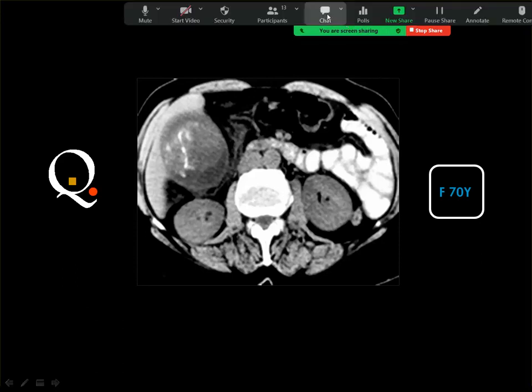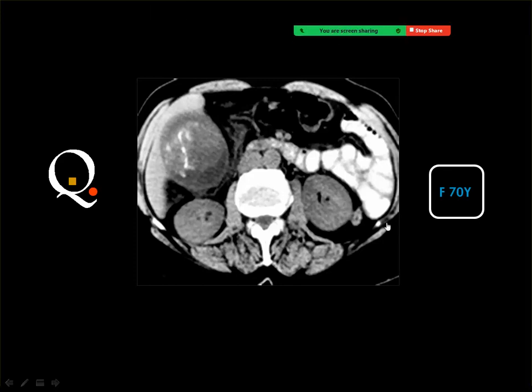If you look carefully at this study, you can see that the gallbladder is distended with a big mass inside it, and the mass showed some linear calcification. You know that any gallbladder mass should be suspected as carcinoma until proved otherwise.